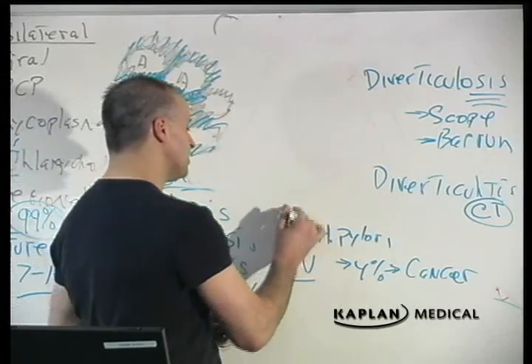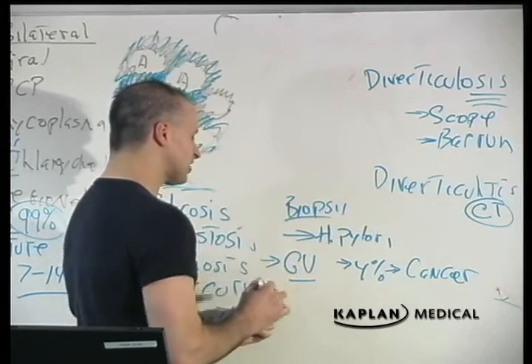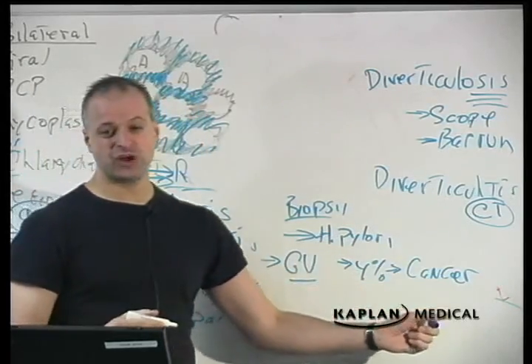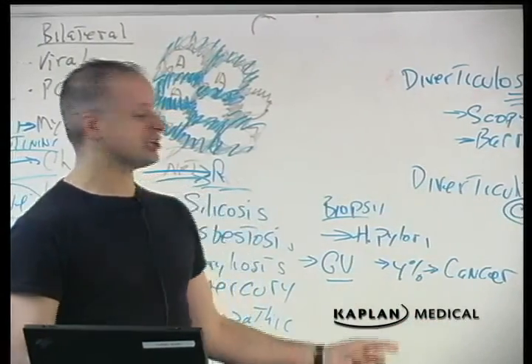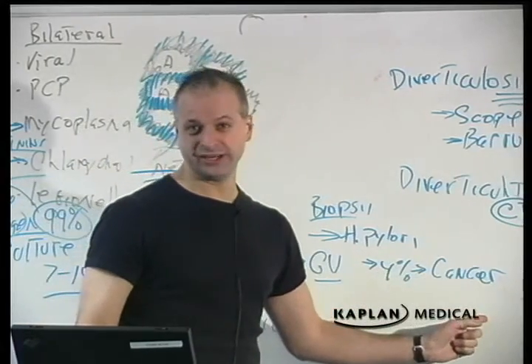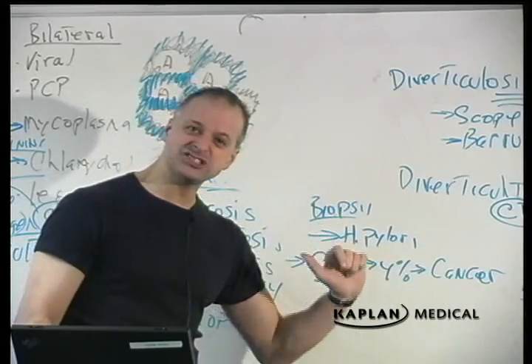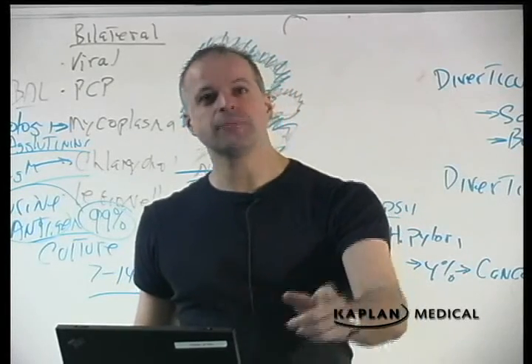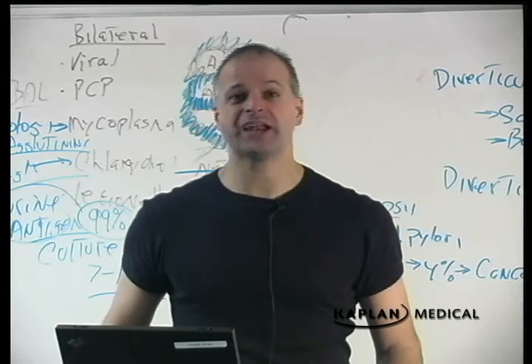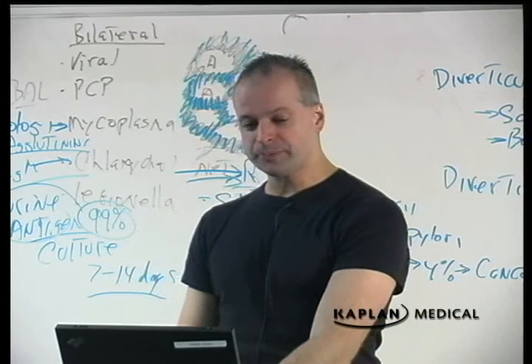If you did the endoscopy, you can biopsy for Helicobacter pylori and know right away. If it's endoscopy, you can biopsy and see if it's gastric cancer right away. Does barium diagnose an ulcer? Yes, it does. It just can't tell you if there's Helicobacter pylori or if there's cancer in it. Now, could you do the barium study and urea breath testing and stool antigen testing? Yes, you can. But it's better to say endoscopy first and only to do barium studies in people who refuse endoscopy. This is upper GI series, and this is an ulcer.